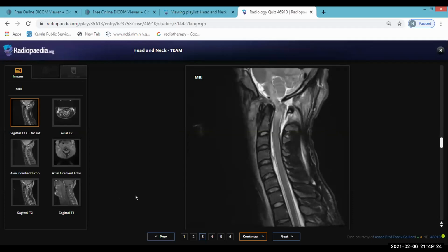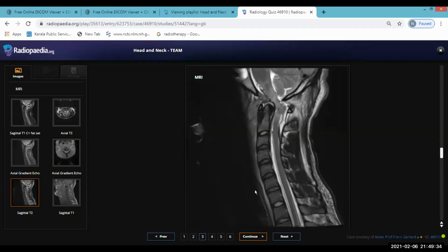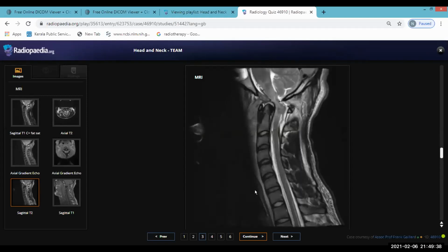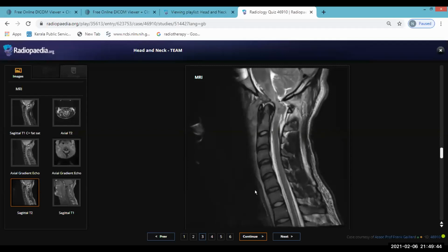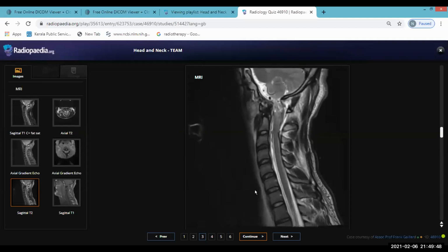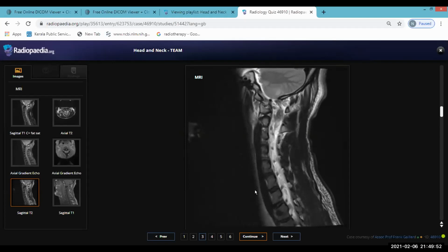So, keeping with these findings, there is a cord contusion in the patient, and I want to look at the prevertebral space to confirm my finding of the prevertebral hematoma. I think there is a prevertebral space hematoma also. The rest of the cord appears normal, with no signal intensity change in the visualized vertebral bodies. So this is a cord injury, cord contusion with prevertebral hematoma.